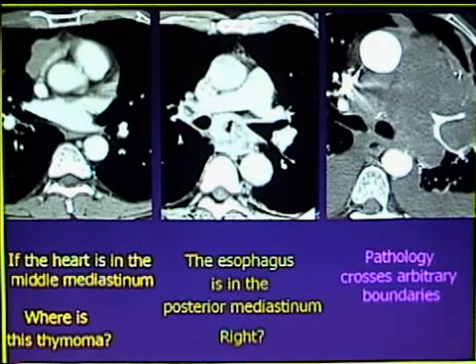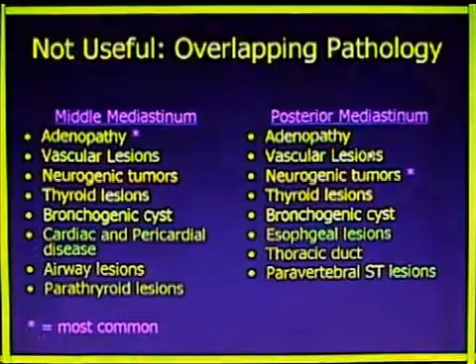And then finally, pathology crosses these arbitrary boundaries, and that's true. This is a small cell cancer which has spread throughout all three compartments.